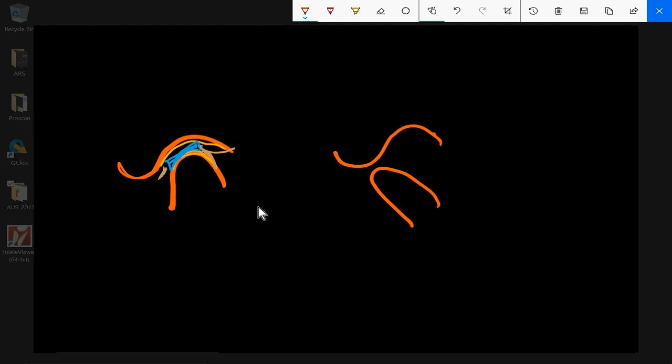So some patients have the ability to open their mouth very, very wide, especially politicians. But dentists know that they can get very large mouth opening in some patients and very minimal in others. And sometimes minimal mouth opening may be pathologic. So typically I see, if I make this a clock face, with this being 6 o'clock, I will typically see the condyle somewhere between 4 and 8 o'clock. And I consider that normal condylar excursion.